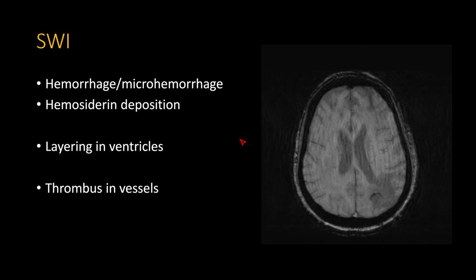Next, I look at the SWI images. That just follows naturally because white matter diseases you see on FLAIR, and then on SWI, microhemorrhages tend to be a part of a lot of white matter diseases. So again, my dictations will flow pretty nicely. As far as SWI, it's basically a susceptibility weighted image. So it'll be very sensitive to anything that causes susceptibility, and those include blood products, particularly hemosiderin, as well as things like mineralization and calcifications, etc.